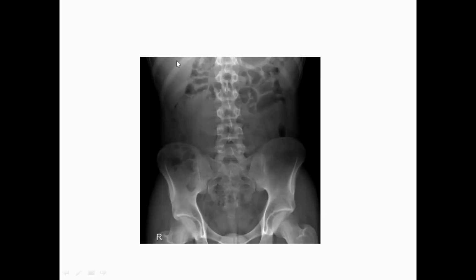So as I said, lower ribs, then lumbar vertebrae, and sacrum. Okay, this is sacrum, and this is also coccyx, and this is the pelvic bone. And here, if you could see, sacroiliac joint. You see this? Sacroiliac joint here. And this is the right side sacroiliac joint. Okay, so you have to comment on all of these normal anatomical structures while you're interpreting. If you know the normal anatomical structure, you will easily identify abnormalities.